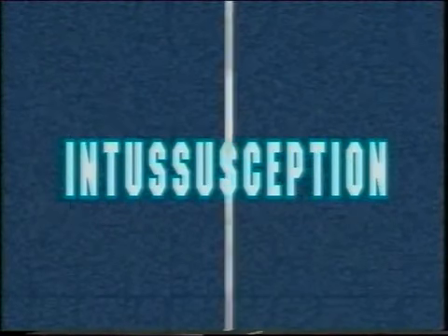Intussusception. Intussusception is invagination of one portion of gut into another immediately distal to it. It is most common in the ileocecal region. Intussusception may sometimes be diagnosed on plain X-ray also.